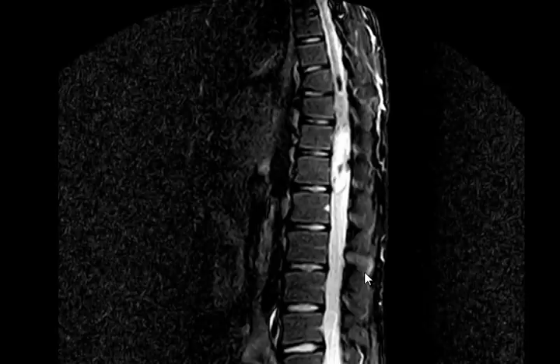These are what? T2 fat suppression or fat saturation. Is it hyper or hypo? Hypo. It was hyper and now on the fat suppression it's hypo. Indicating what? It's not could be, it is fatty. Let's first dissect, then conclude. So there is fat, in addition to other things. Not only fat, there are other components.